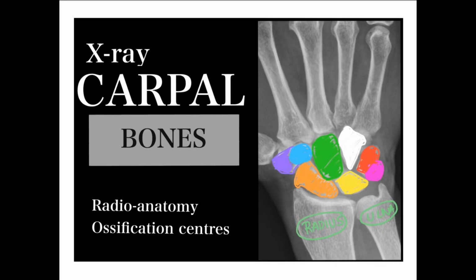In this video, we are going to see radiological anatomy of carpal bones, and we'll see the ossification centers to look at pediatric X-rays.